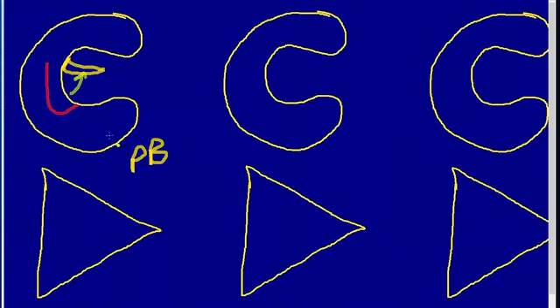Another type of complex tear pattern is, imagine you had a horizontal tear involving the undersurface of a meniscus, and then that changes orientation and becomes a radial tear. And then you've created this somewhat triangular fragment of meniscal material, which has been kind of sheared off of the inferior edge of the meniscus. This fragment might displace almost like a trap door, and it might fall into either the inferior, or if it's on this side, it might fall into the superior gutters of the meniscus. This phenomenon is referred to as a flap tear.